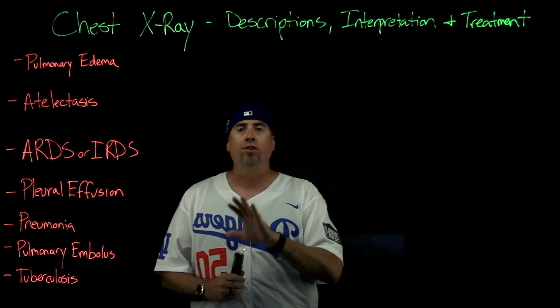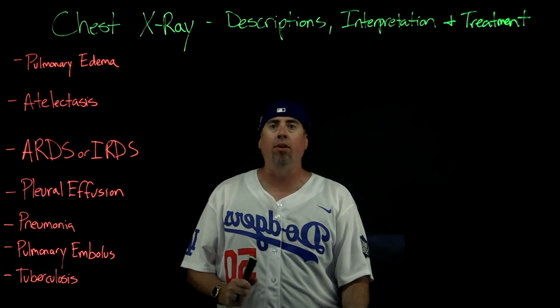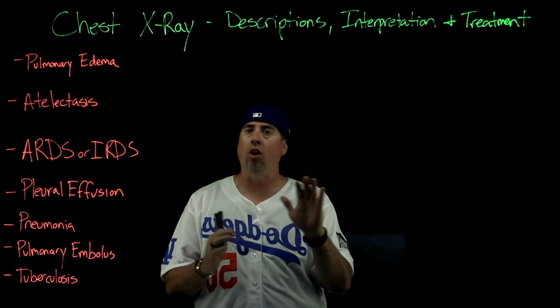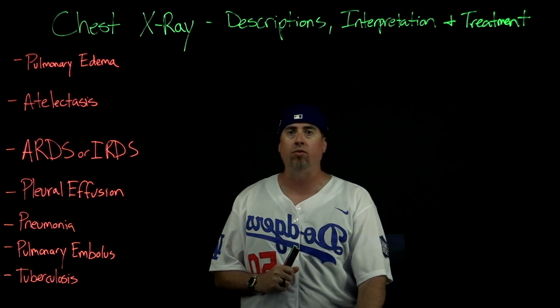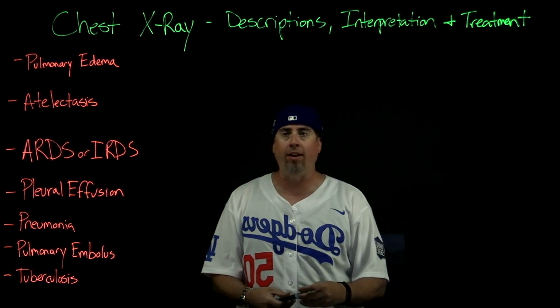All right, so we're going to get started. We're going to go in this order here, guys. And remember, there is a part 1, so if you want to look at landmarks and all that, I highly suggest you watch that video before you start breaking down this video. All right, so let's get started. First thing on our list is pulmonary edema.